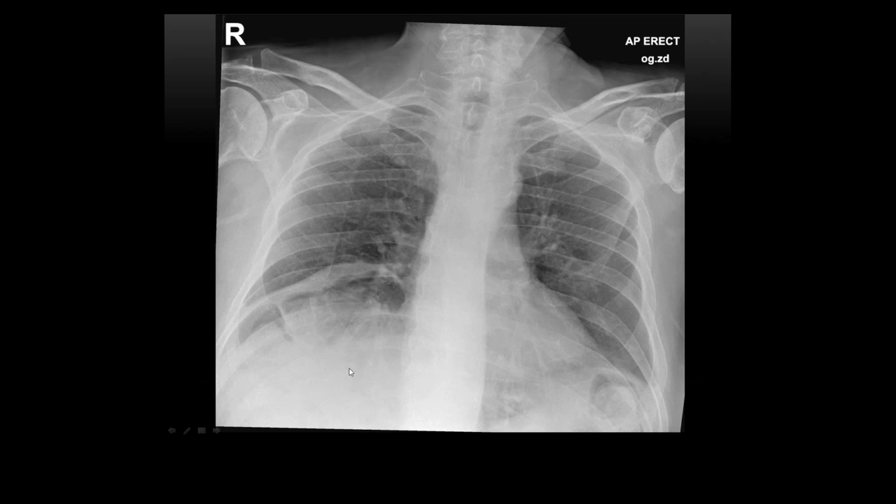You're in the right region, looking at this here. I don't know what that is. Yes, so right in the diaphragm area. It's got an irregular shape. What, are you looking at this region here?